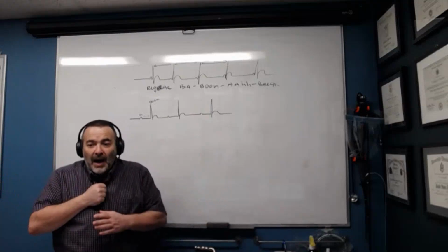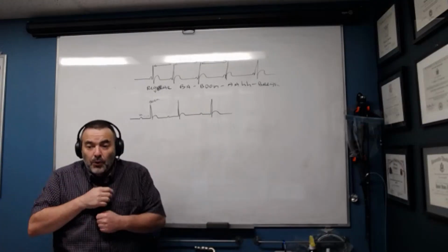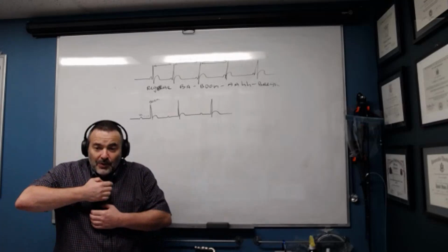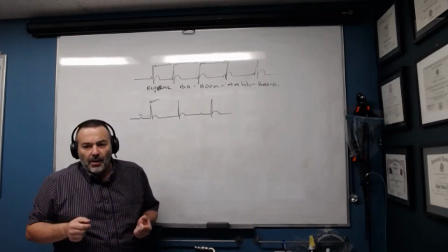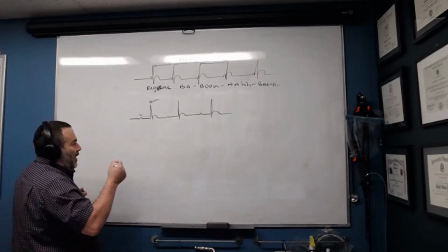No delay. Ba, boom. No, that doesn't work. It's supposed to be ba boom, ba boom, ba boom. So there's a delay between the top and the bottom. Ba, and then boom. Ooh, there's a problem. Now, let's check this out. How about this for a rhythm?